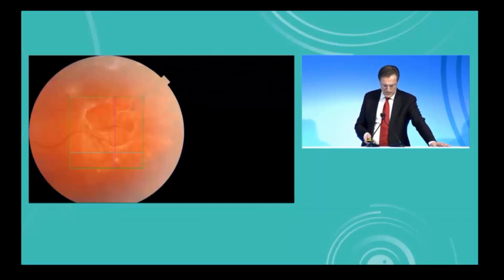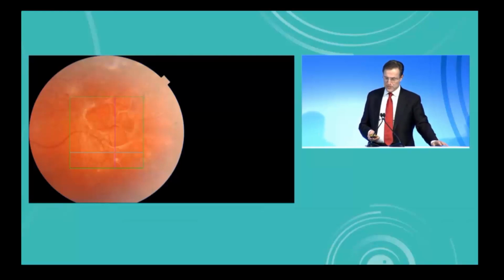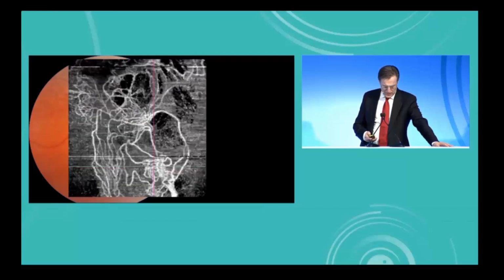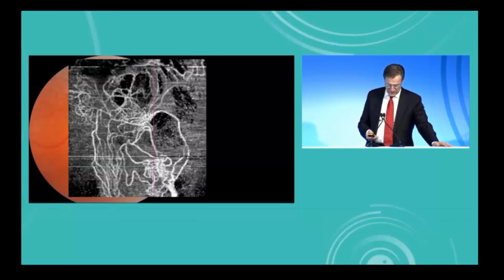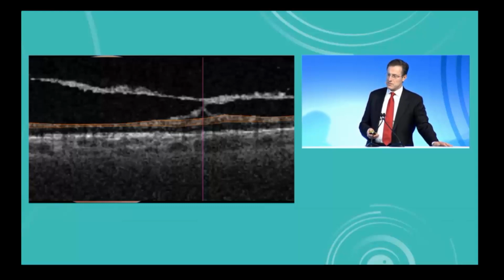And obviously you're thinking about, what about pre-retinal vessels? Well, here's an example of fibrovascular proliferations in a person with diabetes in front of their retina. And here is the outer layer of neovascularization. There's so much fibrosis, you might think there's not even a perfused vessel there anymore, but yes, there is. And here, the deep layer, and here, the connection between the two and an indication of where you are.